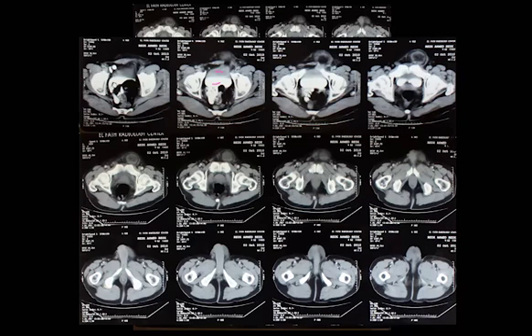Both are true, I think, but whatever lies at a higher level is the urine, and whatever lies at the lower level is the contrast, because it's heavier. If we're standing, it's the reverse.